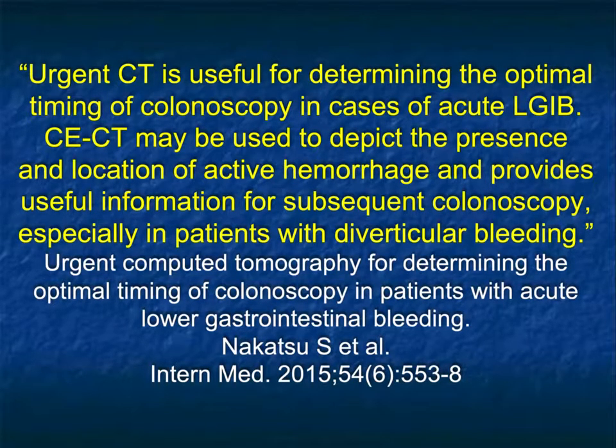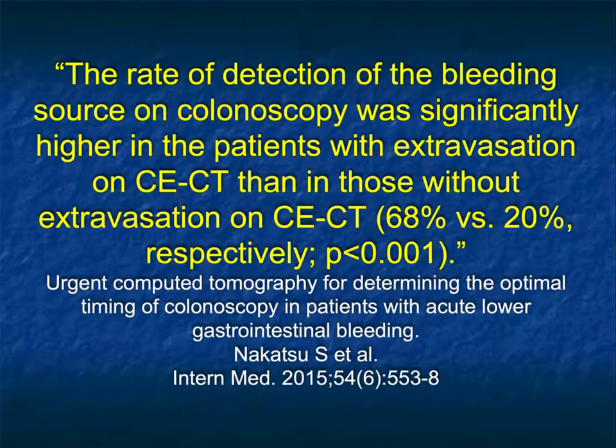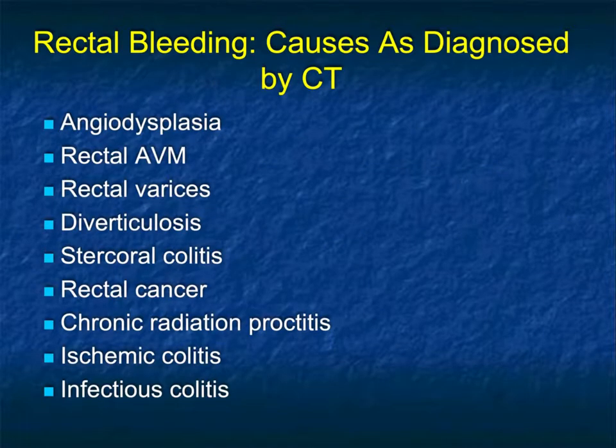And again, remember, people have felt, oh, let's go straight to colonoscopy for a lower GI bleed, which may be a mistake. You may have a lot of blood present and you can't find the cause, or you may not see anything. Here, again, use CTA, and depending what the CTA shows, go from there. And as mentioned before, in patients who have positive CTA bleed, those patients are more than 3 times as likely to have findings of importance and management on the colonoscopy.